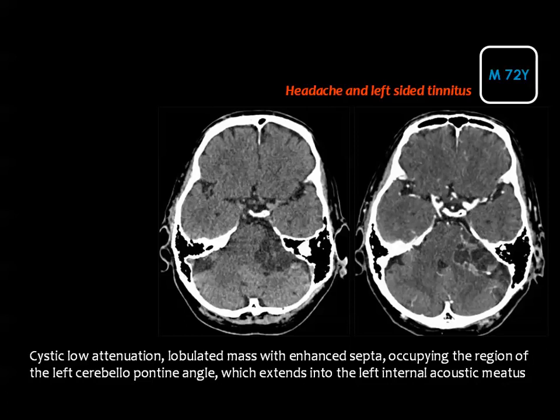Epidermoid cysts do not enhance. No. The most common cerebellopontine angle lesion by far is acoustic neuroma. 94% of the extraaxial lesions at the cerebellopontine angle are acoustic neuromas. And the acoustic neuromas are two types, the neurofibroma and the schwannoma. The schwannoma has a tendency for cystic component.